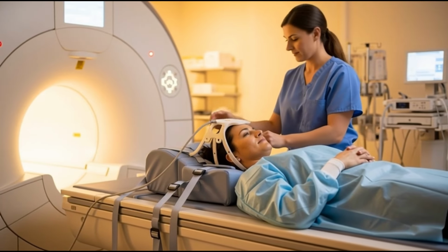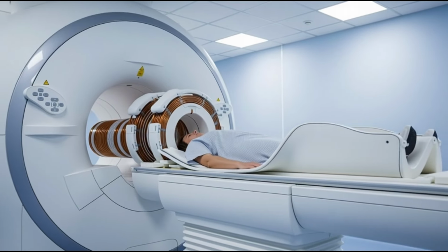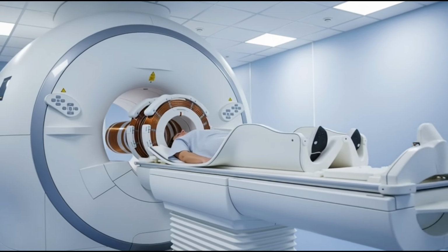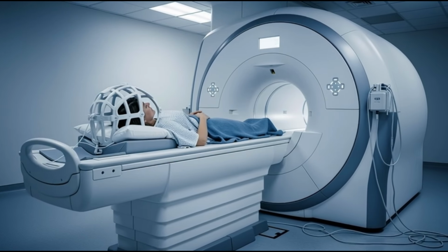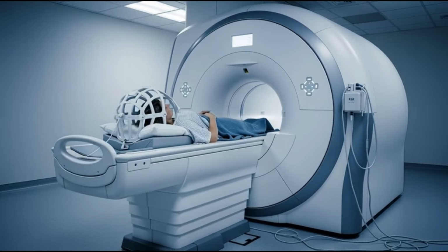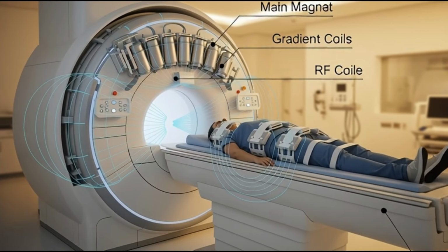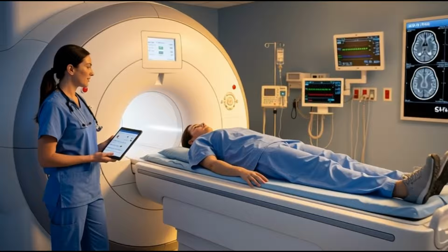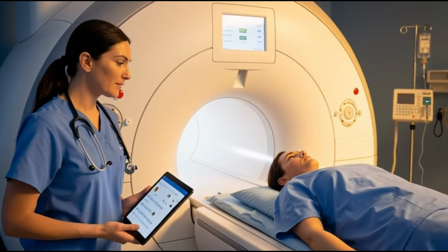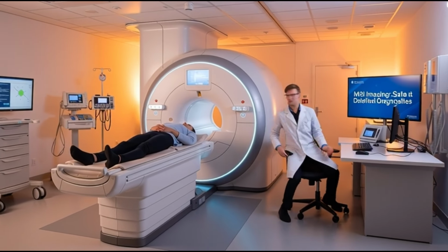An MRI machine consists of several important components. The most important part is the powerful magnet, which creates a strong and uniform magnetic field. Gradient coils help in spatial encoding of signals, while radio frequency coils, also known as RF coils, transmit and receive signals from the body. The patient table allows precise positioning of the patient inside the scanner.